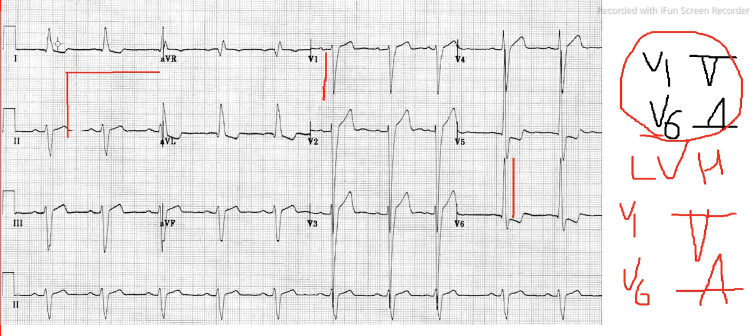So you see here in lead 1, the QRS complex is positive, so the vector representation will be positive in lead 1. Here it is positive, isn't it? So this is going in the positive direction towards lead 1. But in case of AVF, you see the QRS is negative.